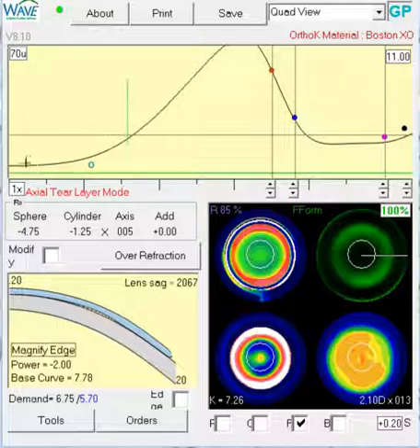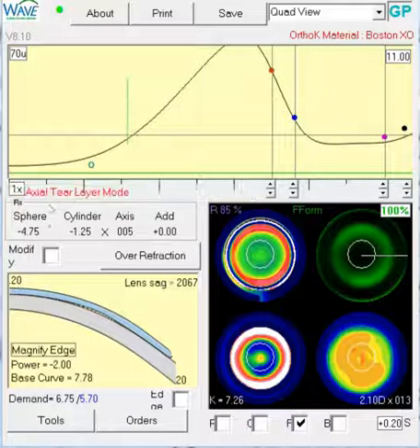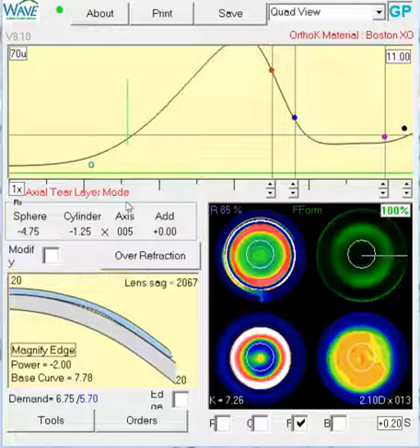And you can see that with a flatter central area, we've pushed the optic zone back a little bit, and this will probably help a little bit with halos. I don't think it'll get rid of the halos completely. It's a higher minus patient, pretty steep corneas, but whatever we can do to help, I think, should get us some better success on this eye. One note about adding positive shape factor: it flattens the center, so you want to watch out for any central staining that's real persistent after the patient's worn the lens overnight.